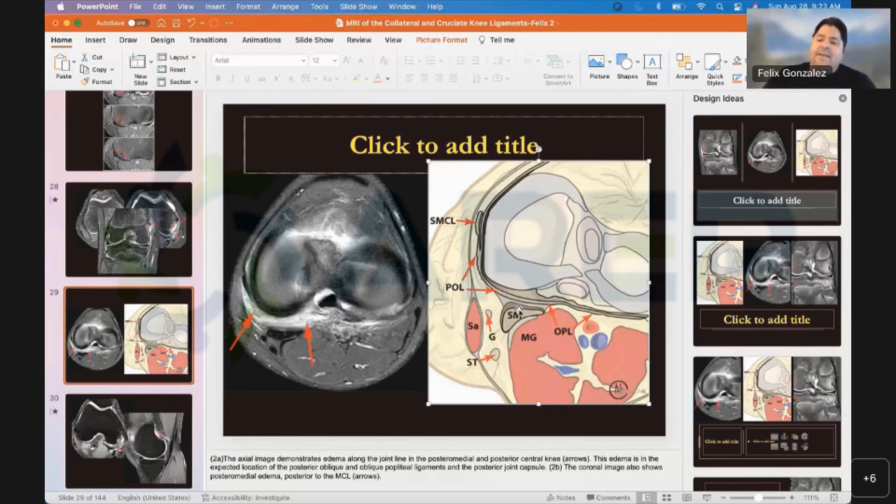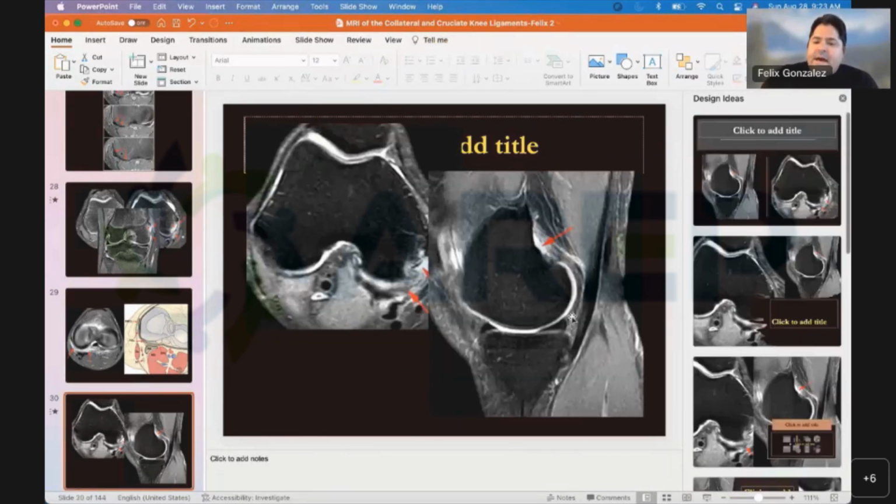But I describe it, right? I say edema with thickening along the posterior medial capsular ligaments, not involving the adjacent surface of the meniscus. Some people believe that if you have meniscal capsular injury, you inherently will have, even at the microscopic level, some injury of the red zone of the adjacent meniscus, the posterior horn of the medial meniscus. I have heard in meetings people say that if they see a meniscal capsular injury, they call it a peripheral longitudinal injury of the meniscus as well.